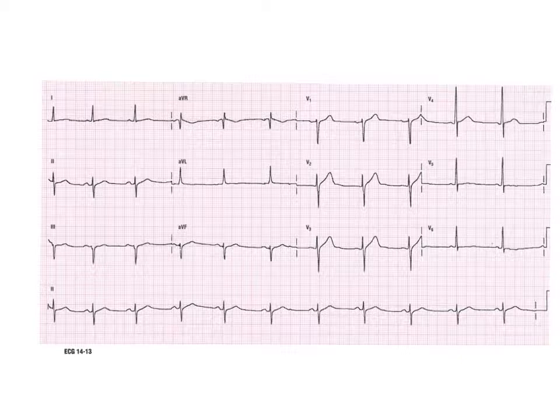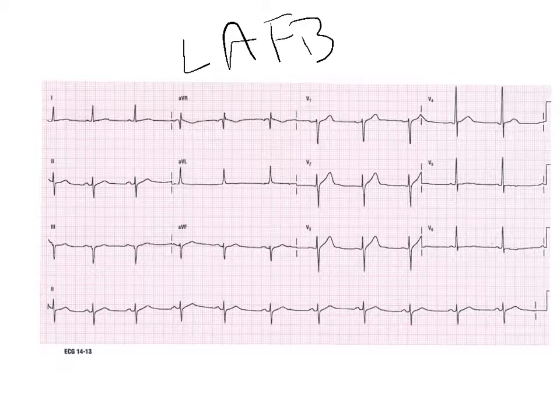Is it good or bad? Well, it's bad because we're more negative than we are positive in lead 2, so we do have what we would call a pathological left axis. So that's going to give us a little bit of a left anterior fascicular block or left anterior hemiblock. Bundle branches are not there because it's not wide, and I don't see any ST or T wave changes anywhere on this thing. So really it's pretty benign except for that possibility of left anterior fascicular block.